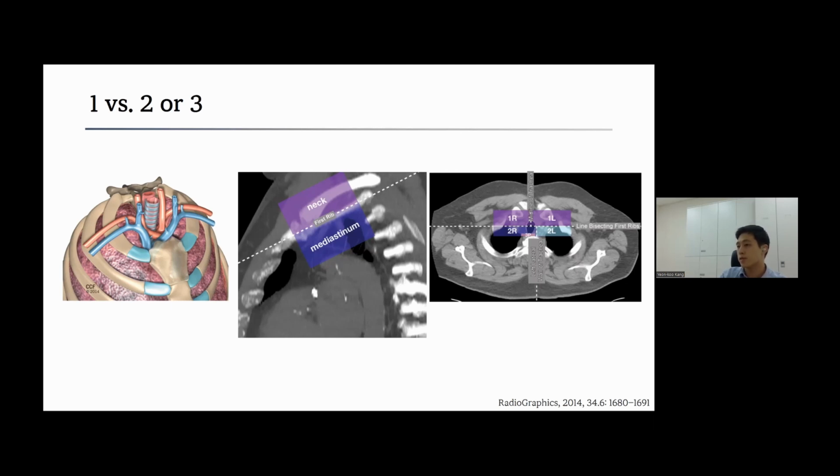So in the transaxial section of the figure 3, station 1 is located at the anterior side of the first ribs or anterior border of the lung apex, because anterior side is the outside of the thoracic cage and posterior side is the inside of the thoracic inlet. And so the station 2 is at the posterior side of the first ribs or anterior border of lung apex.